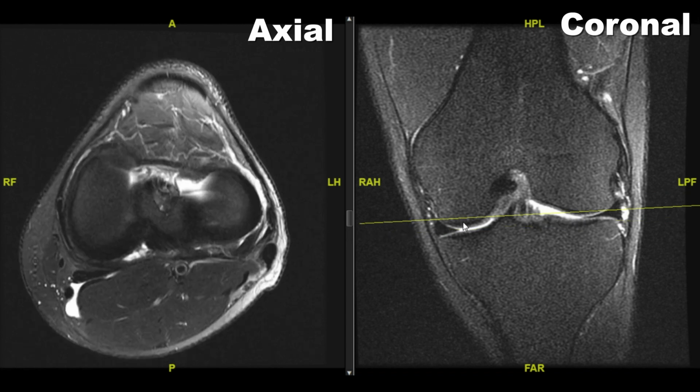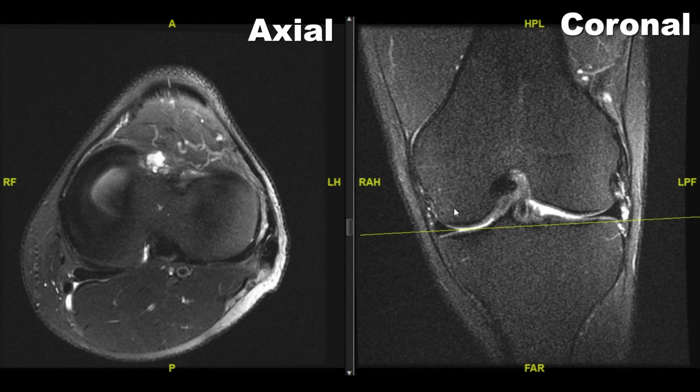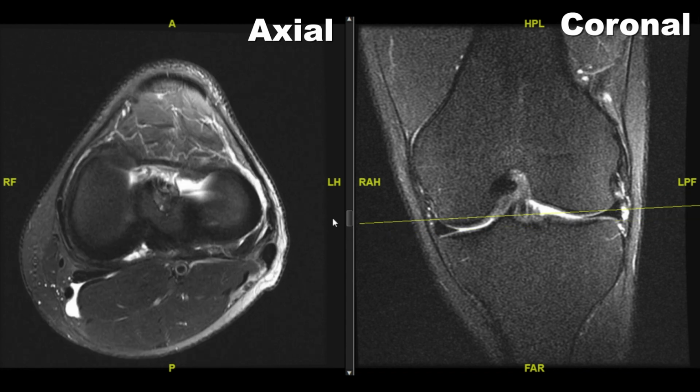And so the MRI takes cuts maybe every 2 or 3 millimeters or so. And so we'll go to about right here. And so this is through the joint on the medial side, through this medial meniscus. And so if we look at where that yellow line is oriented there, we can see on the medial meniscus here, that black C-shaped structure is that medial meniscus where we've kind of shimmed off part of it. And if we go up a little bit more to where our localizer line is here, you can see that yellow line cuts right through the lateral meniscus. And if we look at it over here, we can see how we just barely catch part of the lateral meniscus on that axial sequence.